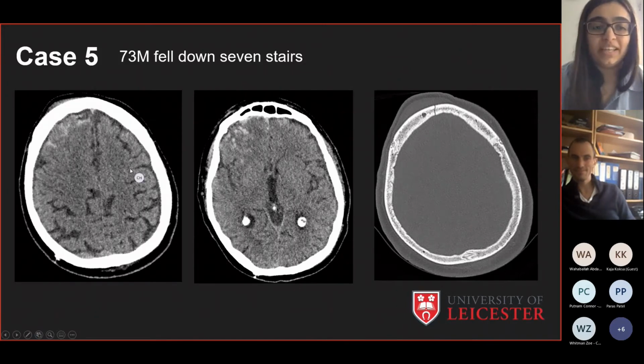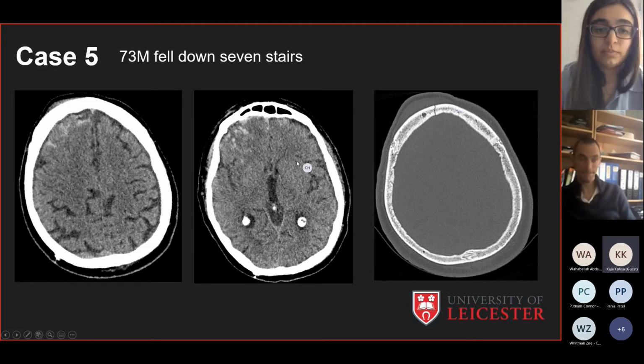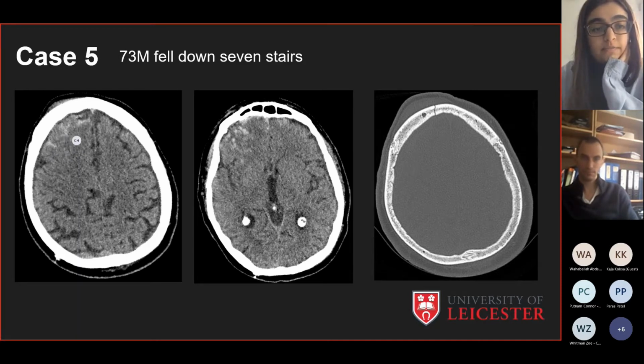Okay, talk me through what you're seeing. So we'll start off in the bone window on the far right. Yeah, there is a fracture in the area, and scalp hematoma. Yep, fantastic. We'll go into the middle one next. What are we seeing on this image? Contusions. Yep. And then what are we seeing on our first image? The subarachnoid. Yeah, so you can see they're quite nice and linear, and they follow the sulcus.